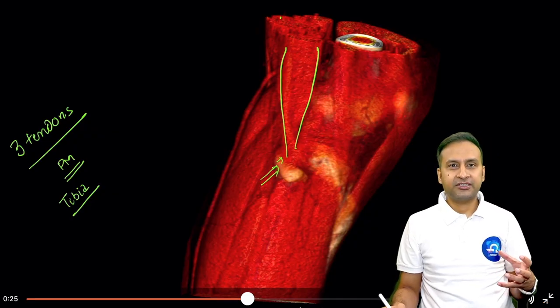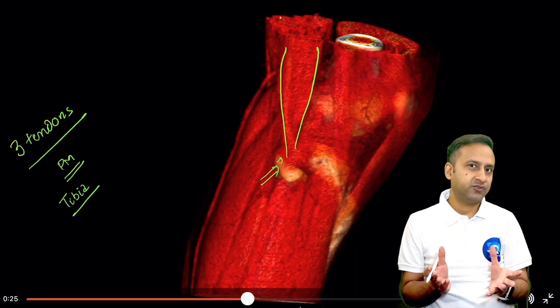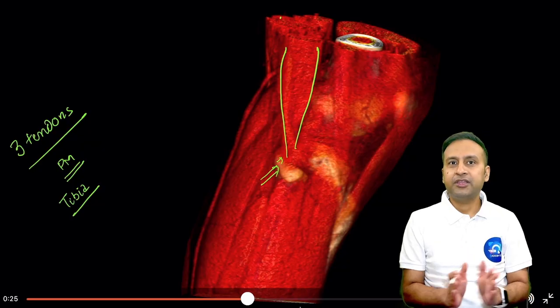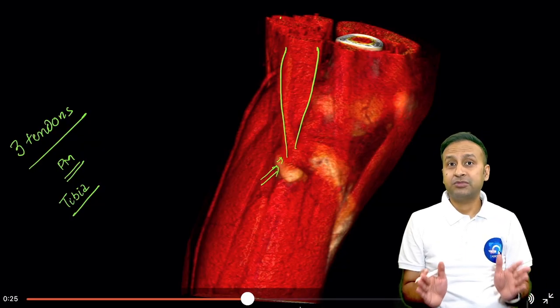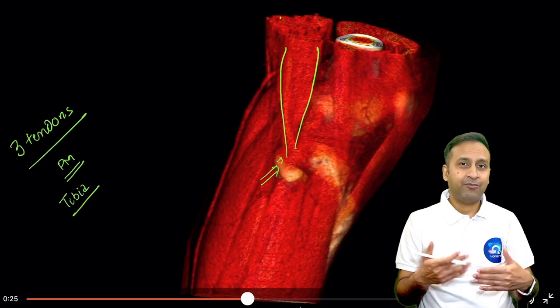And this, to a certain extent, gives us a broad anatomical framework of the various muscles which are located along the knee joint. We still don't know their names, we don't know where they originate from, we don't know their insertion, but still, by looking just at this particular example, we have made a discovery.